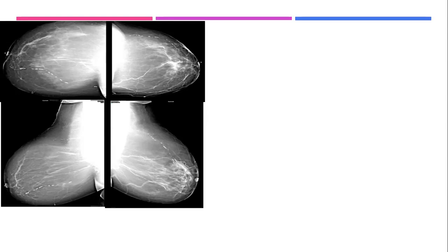So what is next? Yeah, ultrasound. This lady, they had done mammography and ultrasound for her 2 or 3 times and reported it as negative. Apart from the ulcer, they sent the patient to the dermatologist.